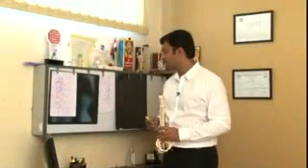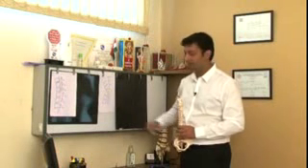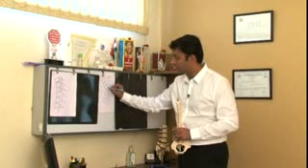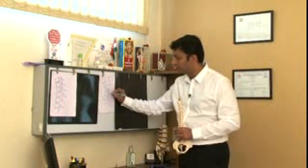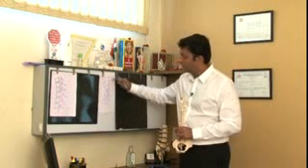In Shubham's case, there was an anomalous vertebra at D12. So this was D10, this was D11, this was D12, this was L1, this was L2, and the spinal cord is getting severely compressed because of the D12 vertebra. Now this condition is called high angular kyphosis.